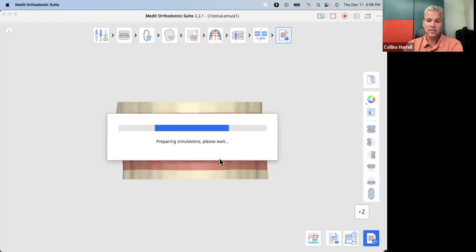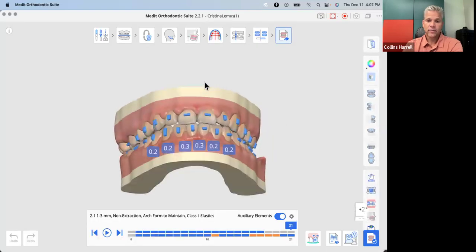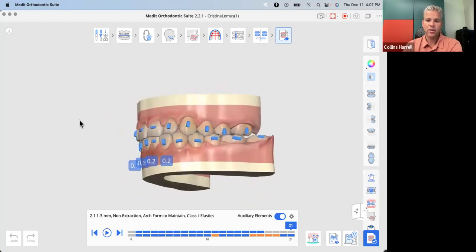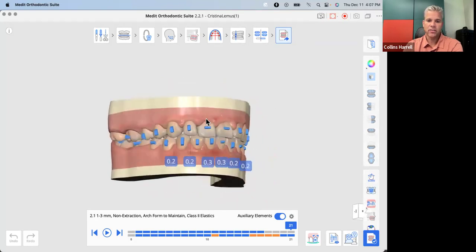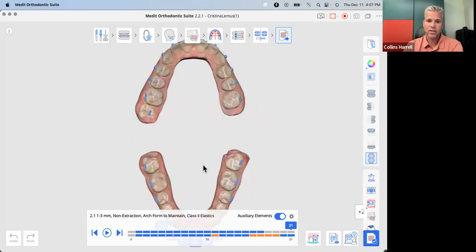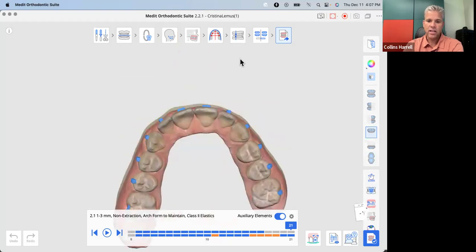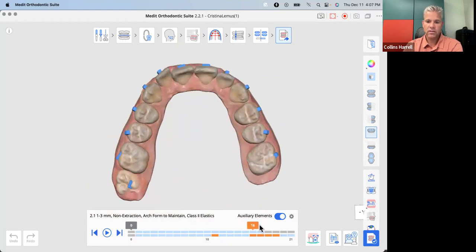So this is what you sent me, which obviously got submitted to progressive aligners. So this setup isn't going to be the one that's actually used. But looking at the setup, I think this is great. Whatever you did along the way, it seems like you did a really good job. Let's look at what you sent me and then see what we get when we do it ourselves all over again. So you sent something that's got 17 stages in the upper.